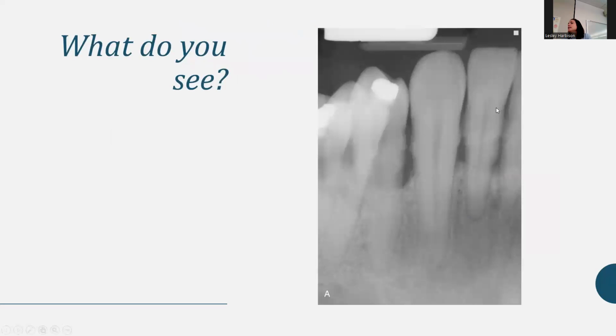So, what do you guys see here? Vertical bone loss. Yeah, it looks vertical. It could be a little illusionary just because we're on the corner, but it does look vertical for sure in that picture. So vertical bone loss, horizontal, tons of calculus. Just guessing, what would you put this for a stage? Three or four for sure. There are no furcation involvements in the anterior, but it's a huge amount of bone loss, so I'd lean toward a 4 as well.